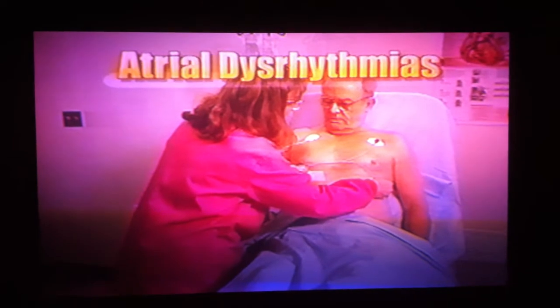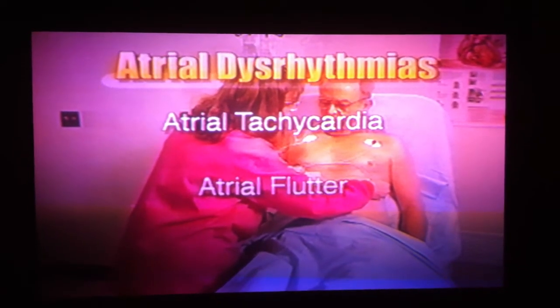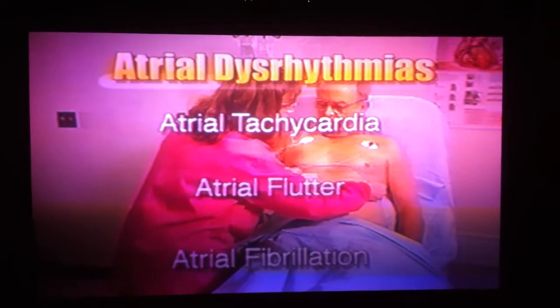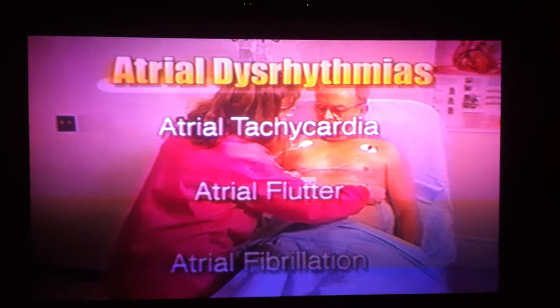When an ectopic pacemaker overrides the sinus node, many different dysrhythmias may occur. Some of the dysrhythmias that may originate within the atria are atrial tachycardia, atrial flutter, and atrial fibrillation. The clinical significance of these rhythms is directly related to the ventricular rate.